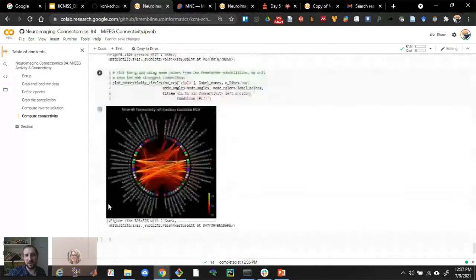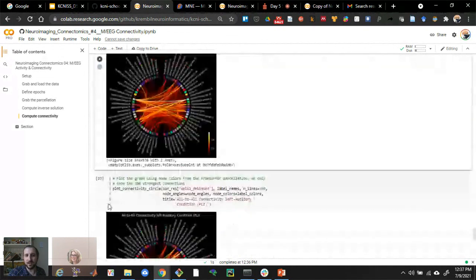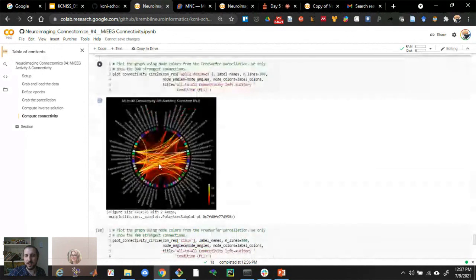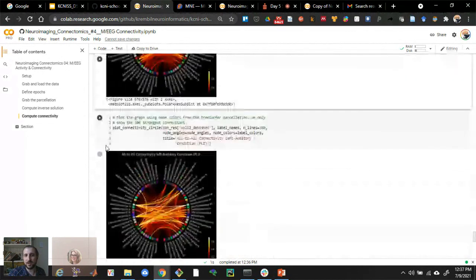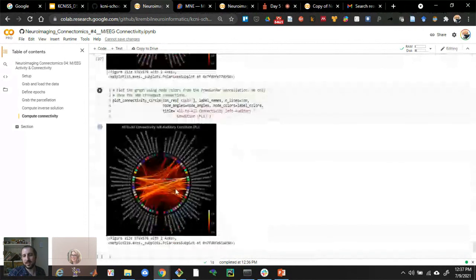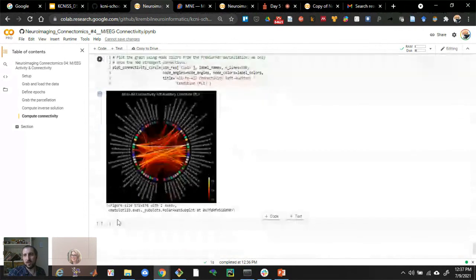So we have those for the 3 different connectivity metrics. They give us somewhat different emphases. The cross-hemispheric connections are stronger in some than the others, but the basic structure is basically similar, as you can see between these 3. And that's also something I would say is kind of a feature of the phase-based connectivity metrics available, is they tend to show similar patterns.